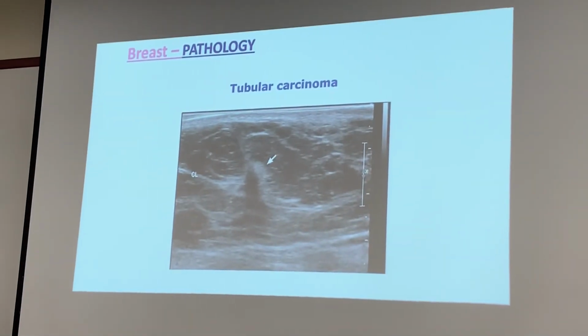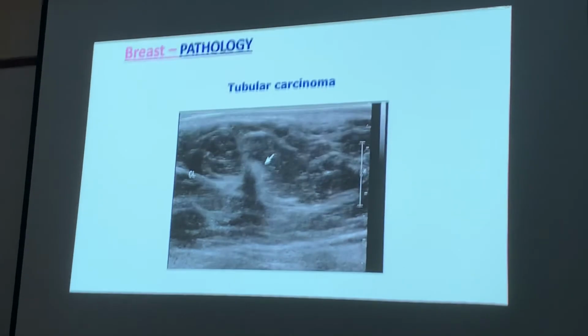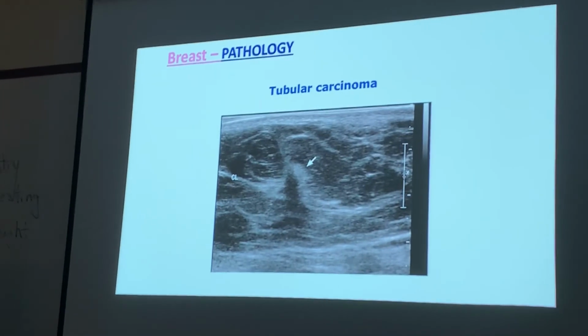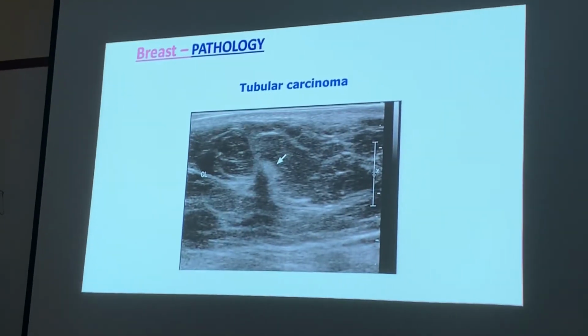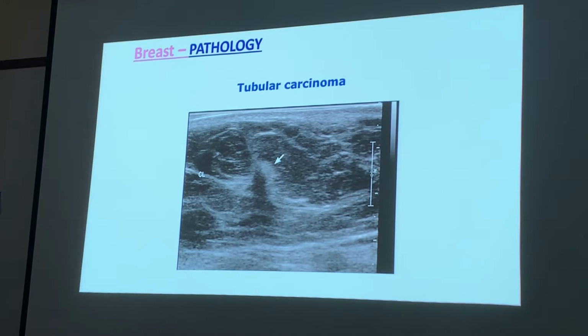And on this image you see, it's not a well-defined cancer. These are the type of things that are hard to spot. When you're doing breast cancer, that's why I give those ladies the most credit, because they have hawk eyes to be able to find these types of lesions that lie within breast tissue, because they're so ill-defined and so hard to see.